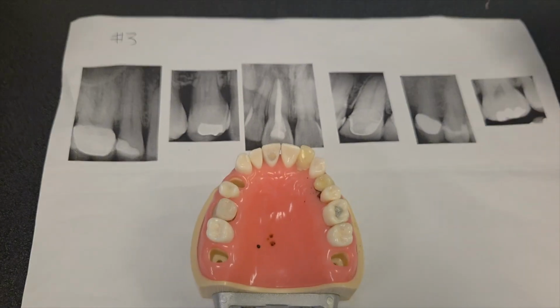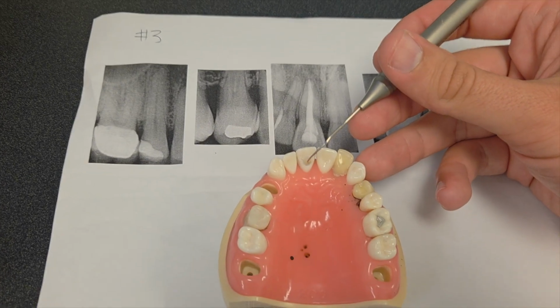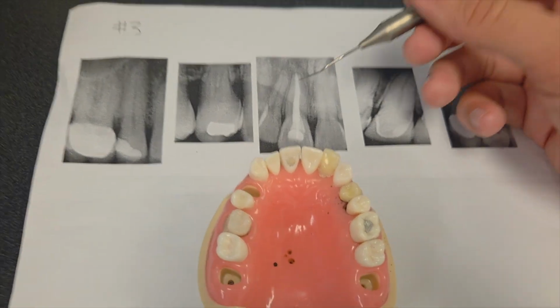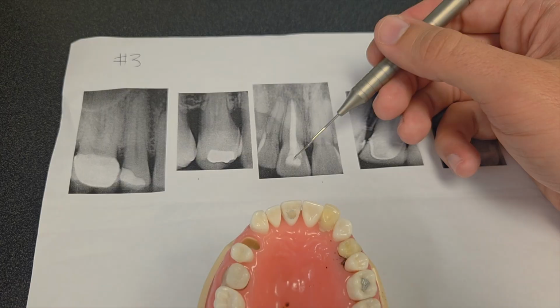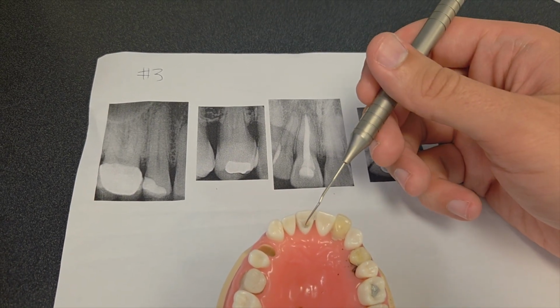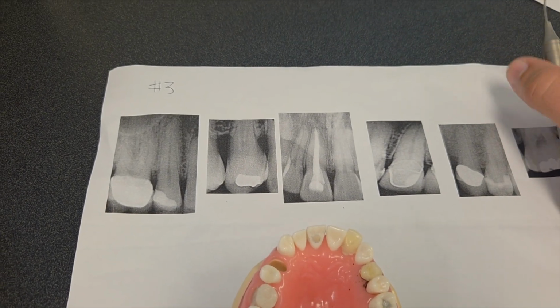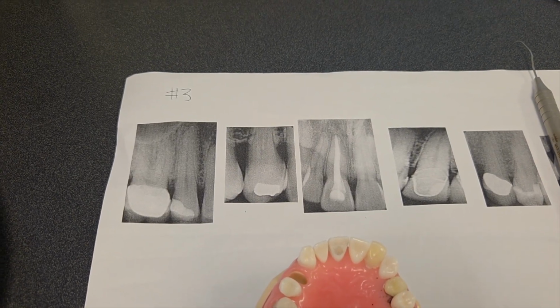Again, going back to the EOIO of the model here, we can see that there is a lingual composite. And using the x-ray, we can also see that it goes all the way up. It's actually a root canal. So that would be the next thing. Using our EOIO and our x-ray, we can tell that there's a root canal and then there's a lingual composite. So we'll go ahead and chart that next on the dentition chart.